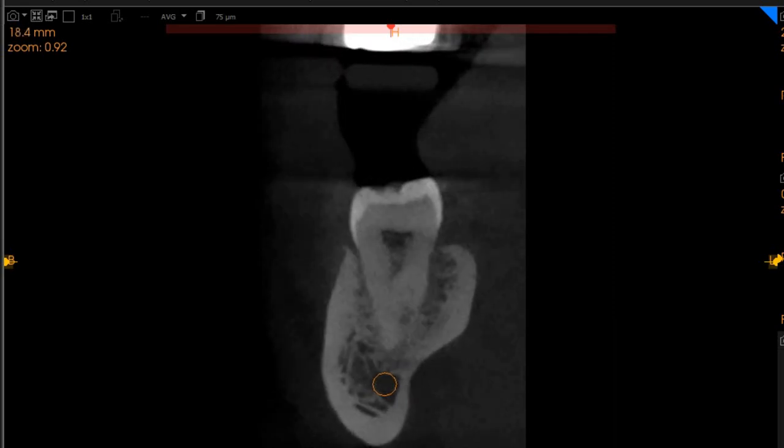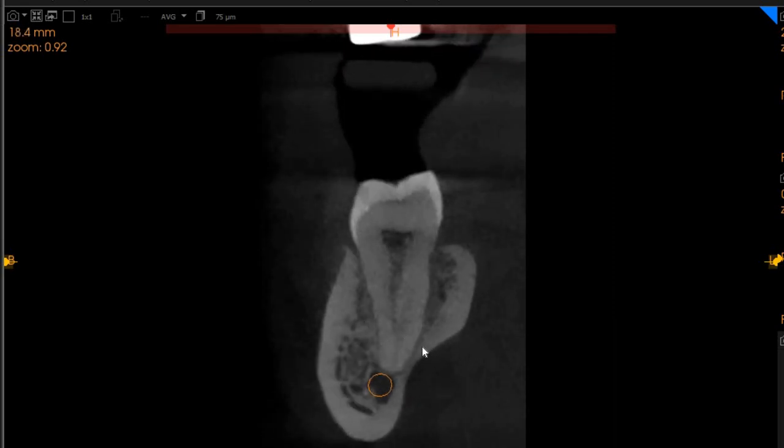And then we move to the distal bit, and the distal root is only one single canal which gets wider in the middle and then becomes narrower. So we can say this is a 1-to-1 configuration of just one big single canal.